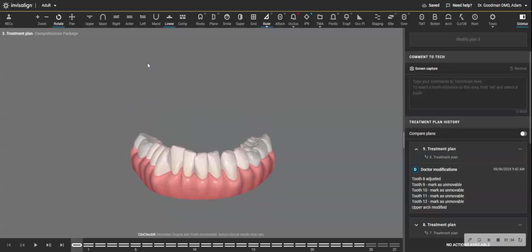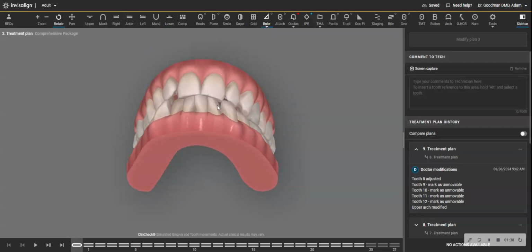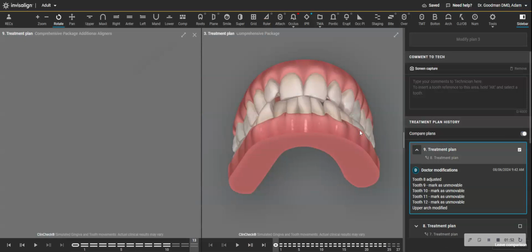However, when you simulate a result, you have to look at the top and bottom together. And when I did simulate this, I saw that taking out a lower incisor would leave the lower arch in too much, but the upper does need some broadening. So now let me show you where we are at this time point, about a year later.